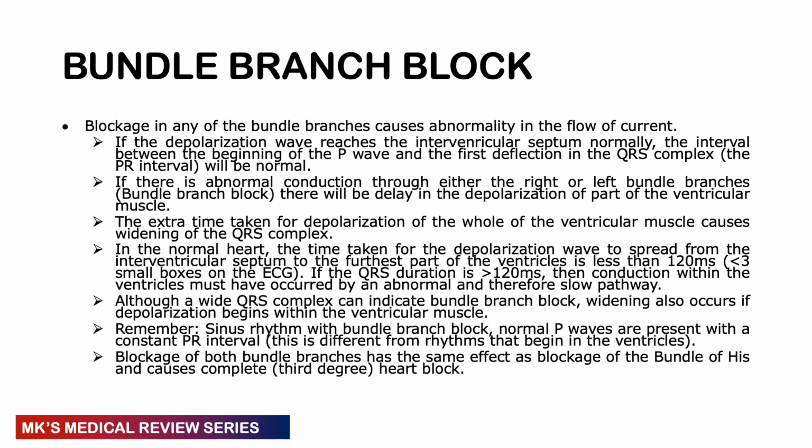It's very important that you actually pick these things up, because, for example, if you have a right bundle branch block, it can make interpretation of your ECG very difficult to do. If you have a left bundle branch block, it may make it almost close to impossible to further interpret, which is why you have to pick up some of these pathologies.